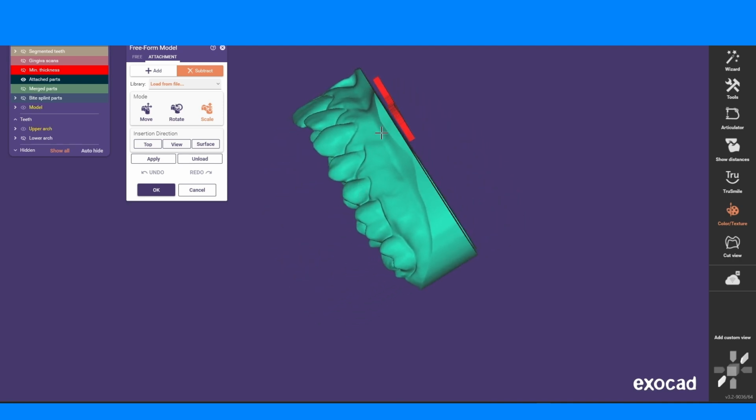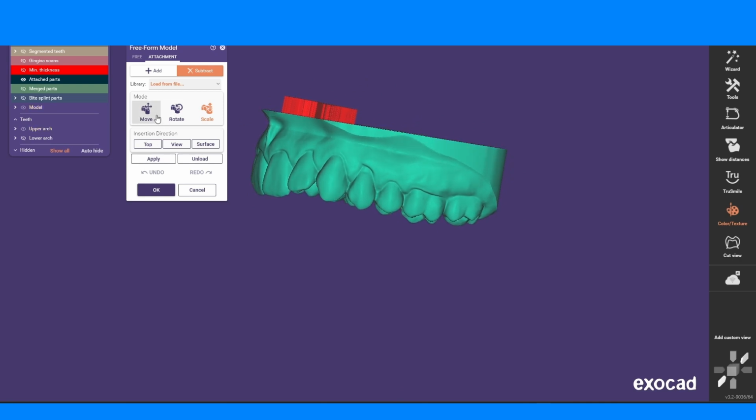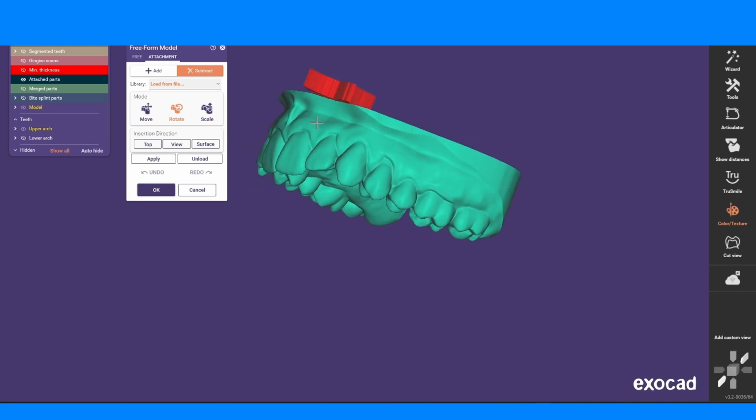You can also scale it in the Z direction without holding down the control button. You just drag the object to give it a bit of depth. Then looking from the side, I'll choose move to freely move it around. If it's not aligned perfectly, say there's a bit of inclination, it wouldn't affect the outcome very much, but to have the optimum output, it is better to have the proper alignment.